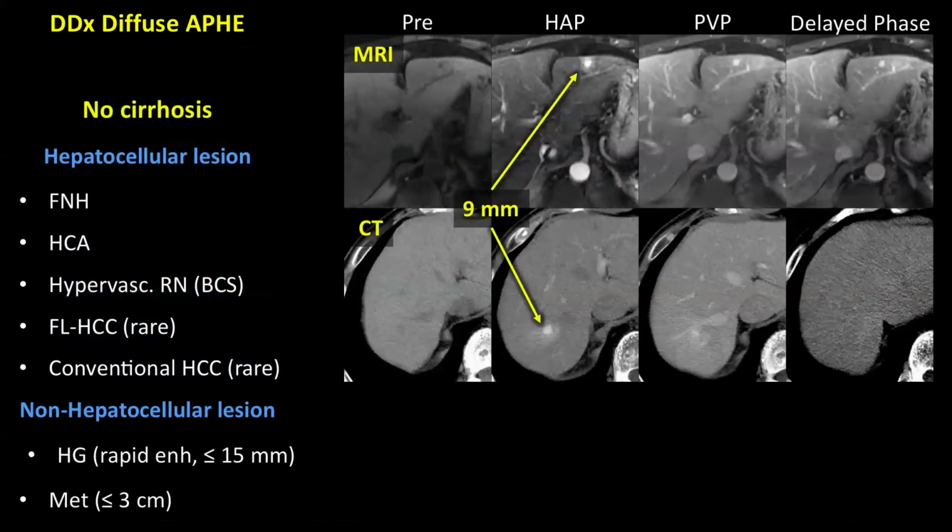On CT, it's not so easy until you notice on MRI that you see something very characteristic of these rapidly enhancing hemangiomas, and this little halo of perfusion alteration. These rapidly enhancing hemangiomas frequently have so-called arterial portal shunting, which results in a cloud-like envelope of enhancement around the lesion in the arterial phase. So now we go to CT, and do we see that cloud-like envelope of perfusion alteration in the parenchyma surrounding? The answer is yes. That is very characteristic of hemangioma, very uncharacteristic of other lesions.